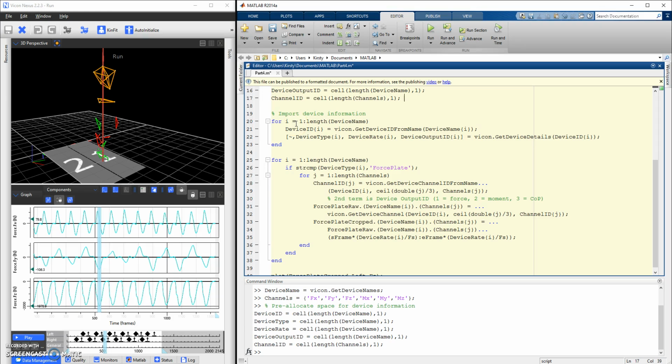Now you're probably wondering why I have it set up to bring in both force plates. Right now I am, because this could be quite a versatile script if it does that. If I was only looking at running data and I always use the left force plate, that might be an idea to say just do this to the left force plate. If you want to use this code on a split belt treadmill, you could do it for a walking trial where you might have one foot on each plate, for example.